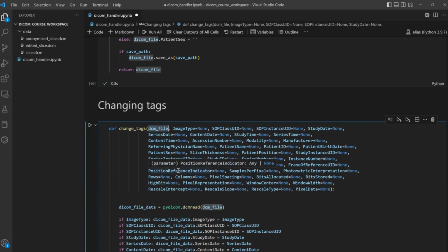I know that some of you sometimes want to change some of this information, but if you use another software, the process may be slow to upload these things. But if you want to run a Python script that does everything, you can use this function directly. It's already ready for that. You can just call it and give it the information that you want to change.